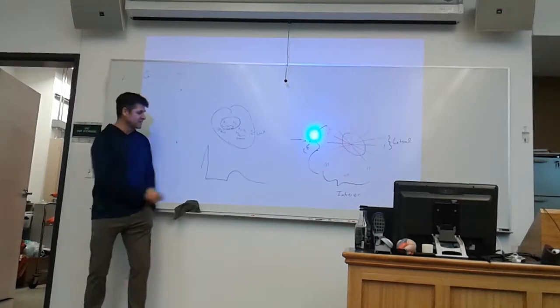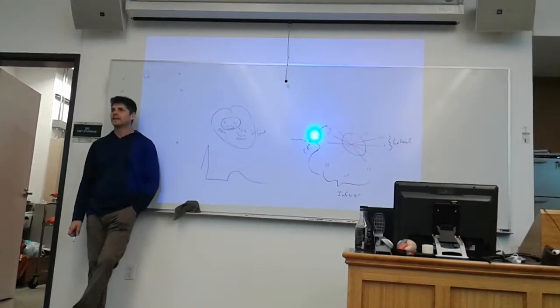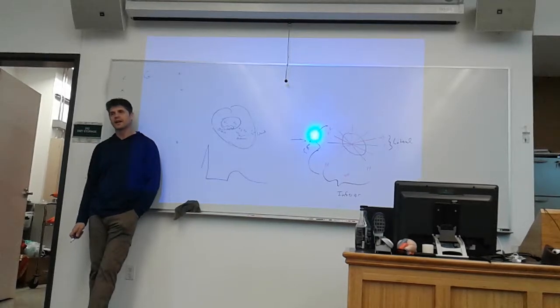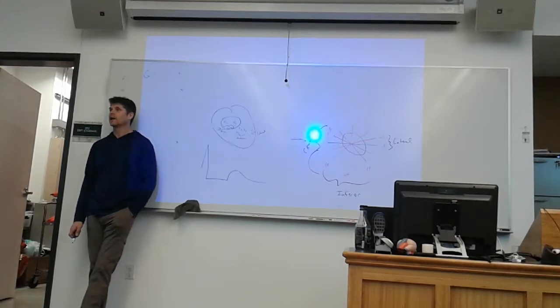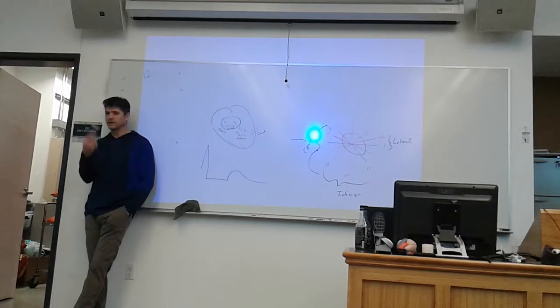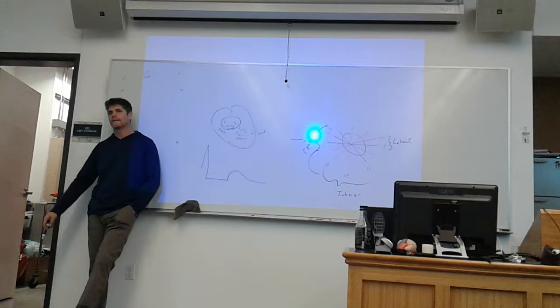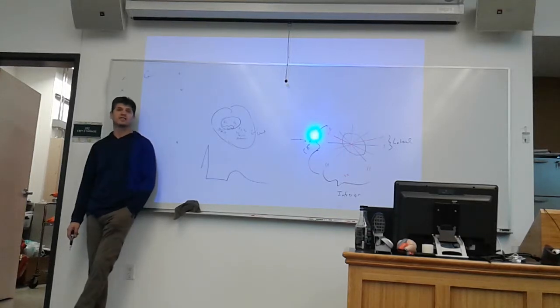In any event, if you see this kind of characteristic ST depression in V1 and V2, it is typically characteristic of a posterior MI. And we would go ahead and, if we have the ability to, finish out your 12 lead into a 15 lead. Which rib space did V6 end in? Fifth. We would just continue in the fifth rib space to the spine.